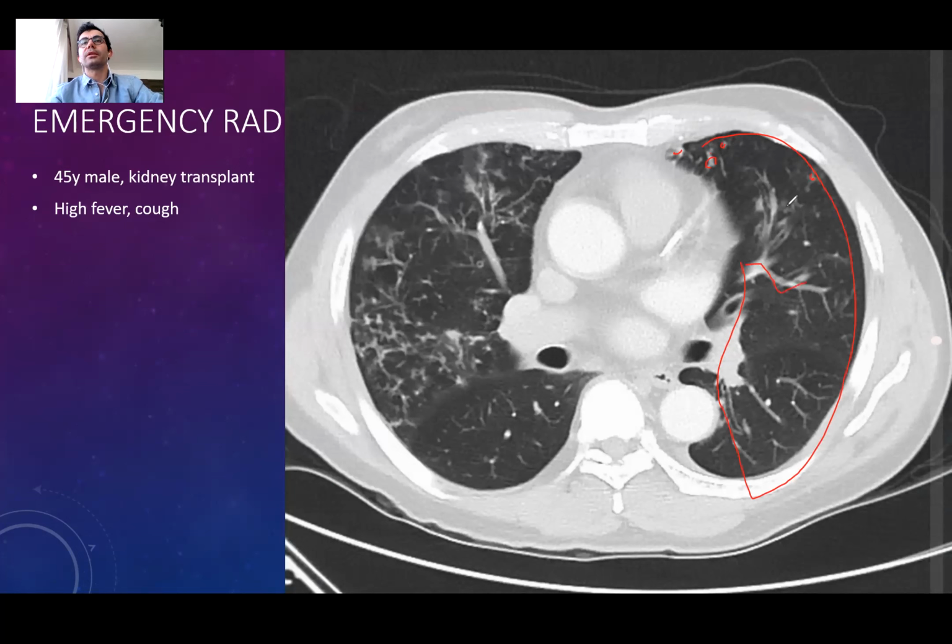These are pulmonary vessels. But on the right side, on the upper part, this is the part that we have seen on the chest X-ray, right? I'm seeing densities like this. I'm seeing linear densities.